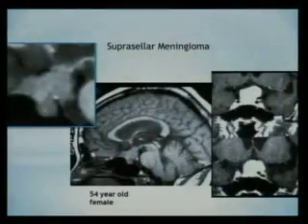Now this is a suprasellar meningioma. And again, they don't always read the book, but if they go by the book, then on the actual image, the sagittal image, you see a nice little sella turcica here. And there is tumor all over it on the top. This is the meningioma.